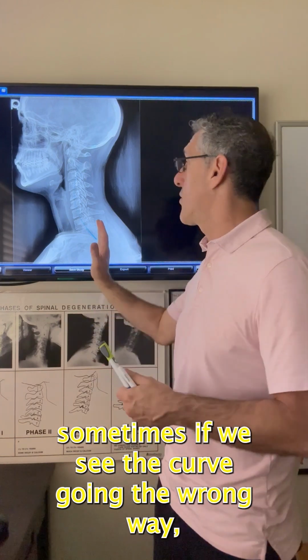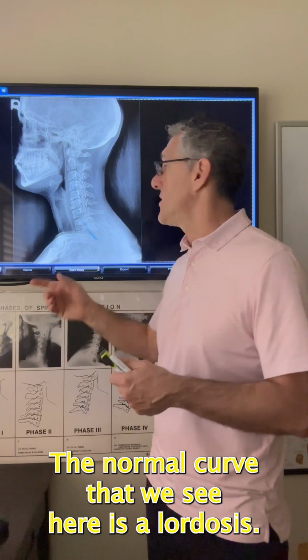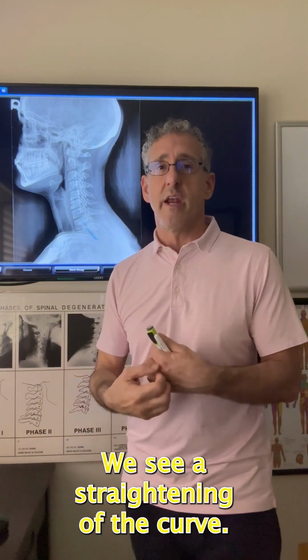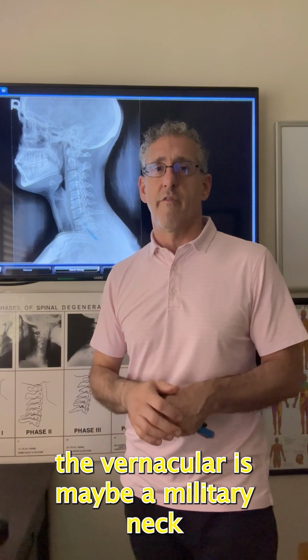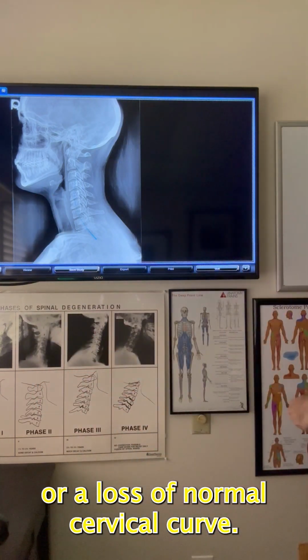Sometimes if we see the curve going the wrong way, we call that a kyphosis. The normal curve that we see here is a lordosis. We don't see the lordosis here. We see a straightening of the curve. The vernacular is maybe a military neck or a loss of normal cervical curve.